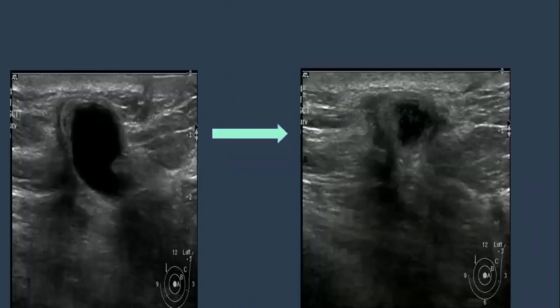Yeah, I remember, we just followed the patient for that one. Okay. Well, this is also my patient. So it's obviously, from this cyst-like appearance of the skin, post-surgery. It's obviously post-lumpectomy.